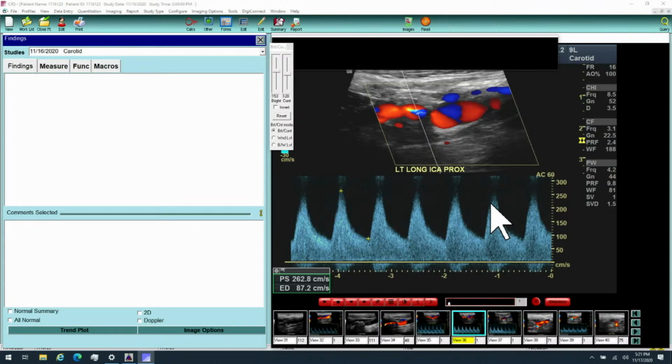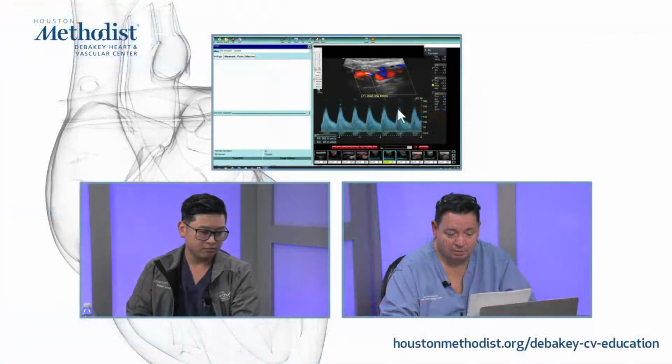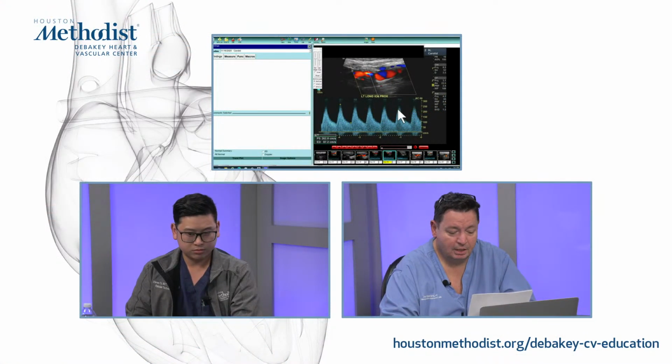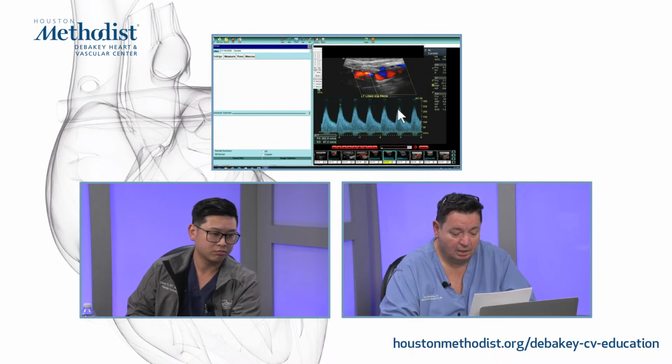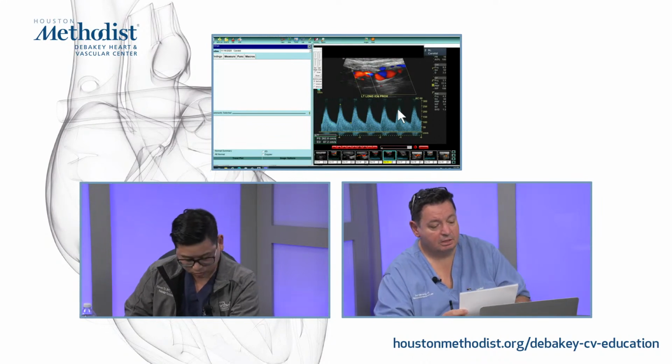So definitely that 77 millimeters of mercury difference confirms a severe right-sided disease in the subclavian. But when we are coupling it together with the abnormal waveform in the right common carotid, we definitely think this is a really severe innominate stenosis. And I think we just recommend imaging correlation, basically. So, well, thank you for this beautiful case on the weekend.